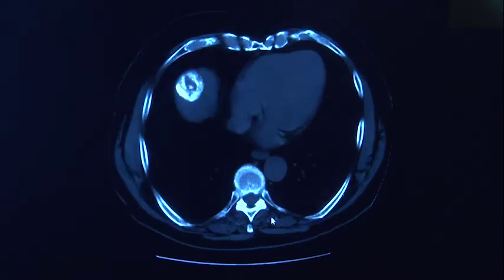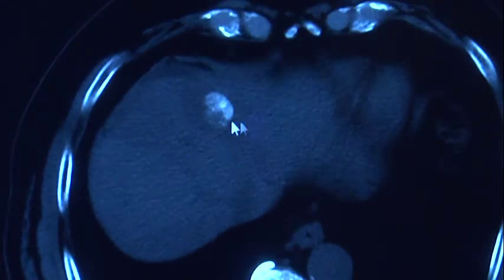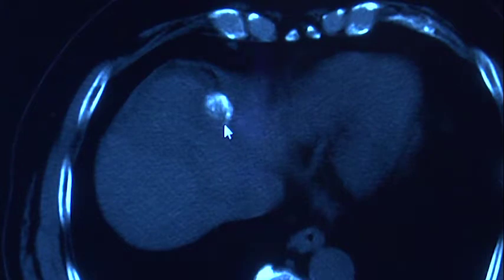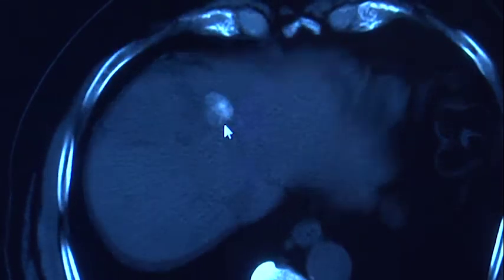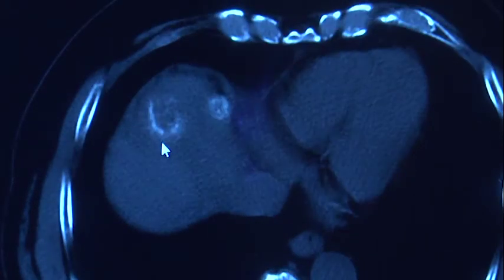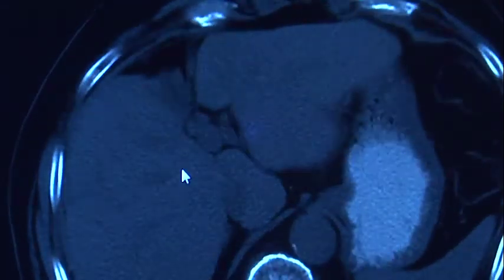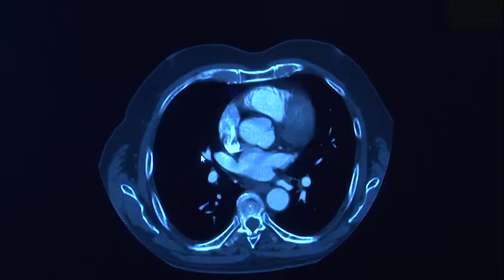More than 2 years after this, in the vicinity of the lesions that were present before, you'll now see a relatively white ball. One of the two components that we administer, one of the embolic components, will show up on a CT scan as being white. And so this is just the residual of what was injected 2 years ago. And that portion of tumor is dead.